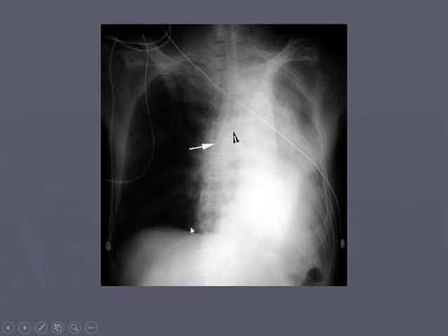In fact, this one's a little hyperinflated, so we have the volume of air for 2 lungs in 1 lung. That's why this is hyperinflated, and he's not getting any ventilation over here. This is all atelectatic, not getting any ventilation at all. This is an emergent call to the ICU saying, hey, you need to pull the tube back a good 6 or 8 cm.